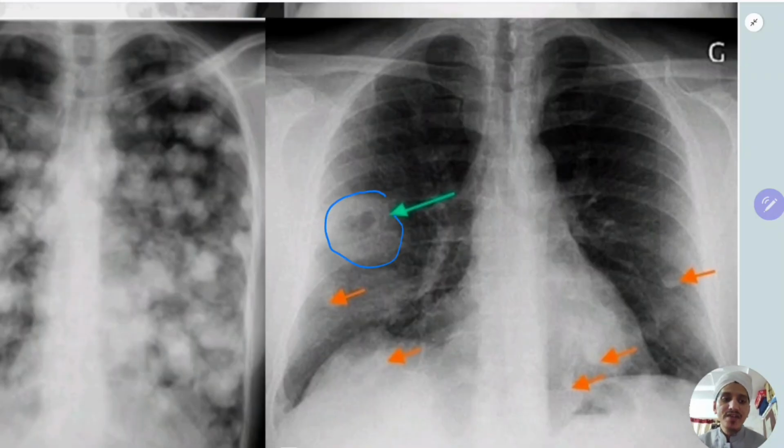So this can be a fungal infection, because in fungal infection you also have cavitatory masses, or it can be an abscess, but we don't know here. But an abscess is usually single, not multiple. Septic emboli, as we have discussed, are multiple. What are the different possibilities? Number one, metastasis; number two, septic emboli, yes, it can be, we don't know; and third, fungal balls, they also present like that, or it can be autoimmune also. Let us see what the diagnosis is.